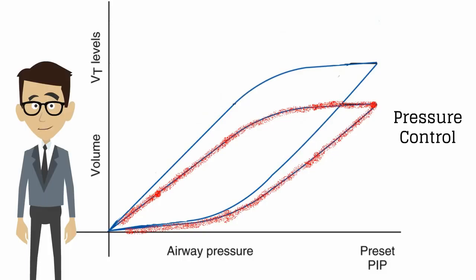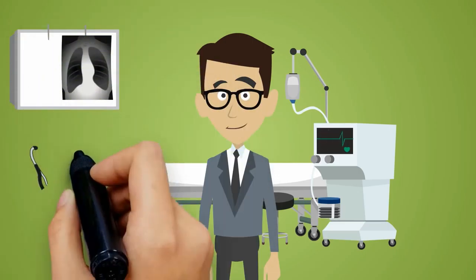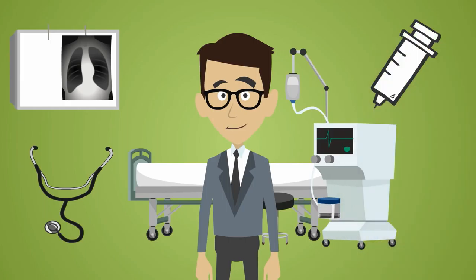A similar thing happens in pressure control. When the lung shrinks, the ventilator has to keep the same pressure, but notice now that the volume decreases. This shows us that the lung has decreased in compliance, and notice that the graph still shifted to the right. Notice how I haven't even looked at an x-ray or auscultated breath sounds or even gotten a blood gas, and yet I can still see that once the graph shifts to the right, this patient's lung has decreased in compliance.